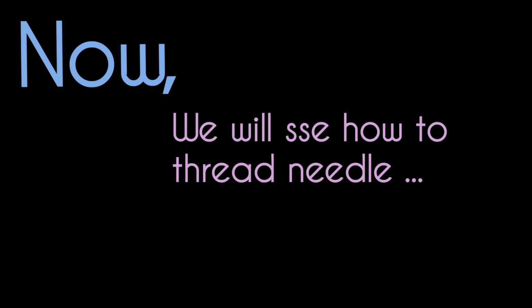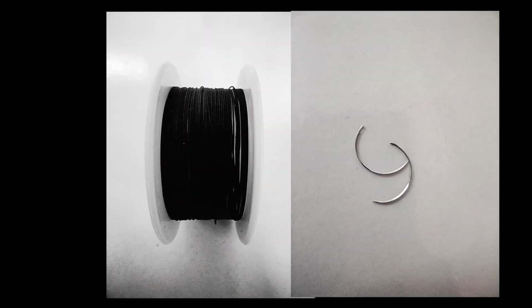Now we will see how to thread the needle. This is the suture material. You can see that we can thread the suture material into the needle.